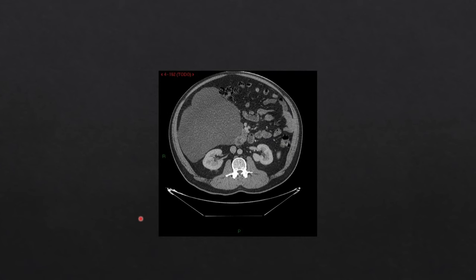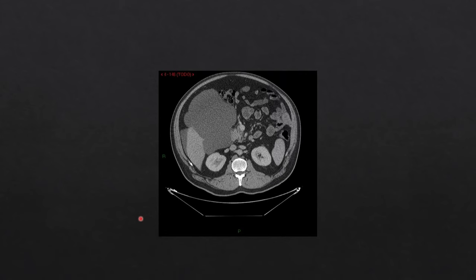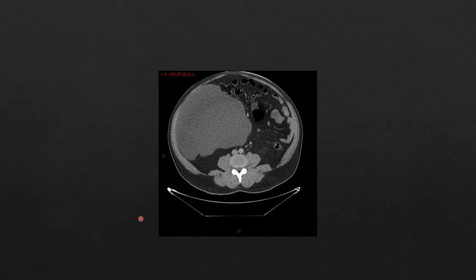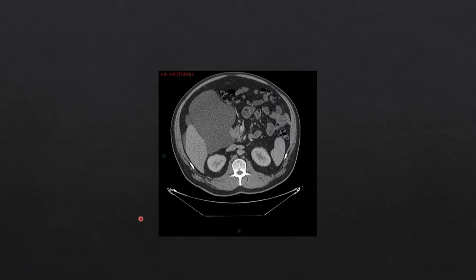So we are in the context of a cystic multiloculated mass that we found in the abdomen, mainly in the right abdomen, but we can't see that this mass arises from any of the abdominal structures. So this is not a tumor that arises from the liver, nor the kidney, nor the pancreas. And we see that it is not conditioning the collapse of any of the vascular structures either.